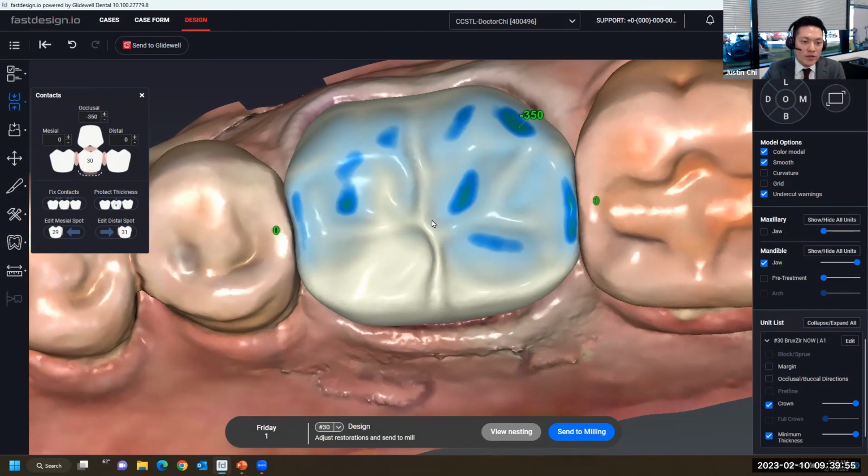This is where once I mill it, it is actually within contact. And sometimes I still need to touch up a couple spots, a very light polish to remove any heavy interferences. But otherwise, this is the zone that I like my designs to be at.